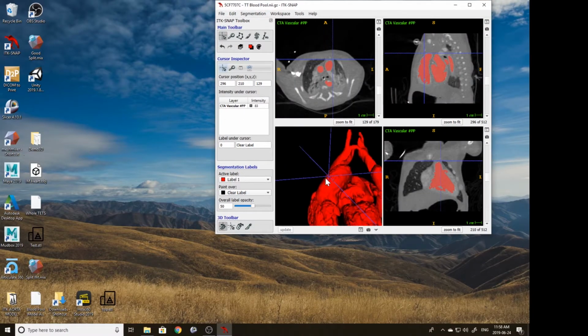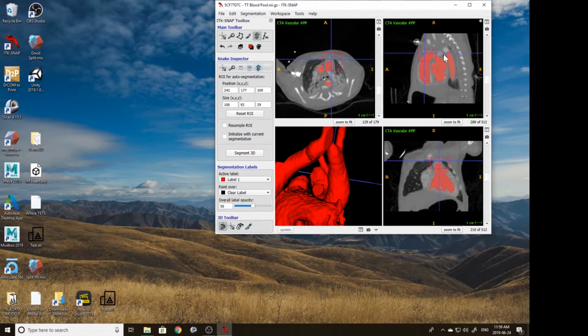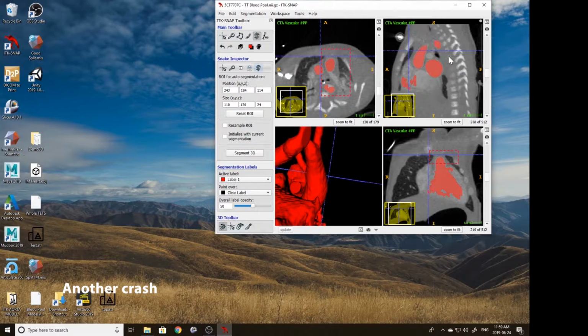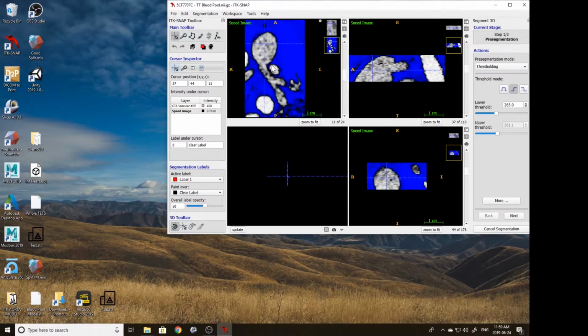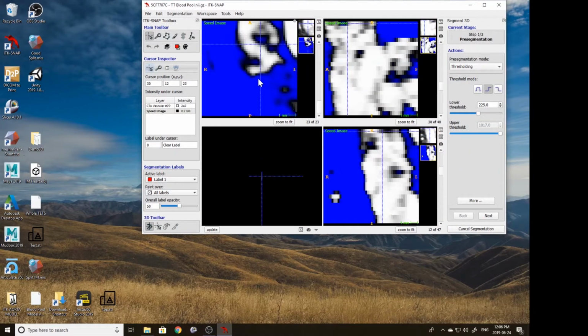Model there, and we got a fairly large segmentation. Again, remember to save. We'll just go through some more, setting up the ROI box, going through the scans to make sure that I'm going to be able to identify what part I'm actually wanting to segment out. So there are the arteries. So here there are some spaces where it's fairly close proximity to each other, so I want to make sure that I'm getting just those little chunks.